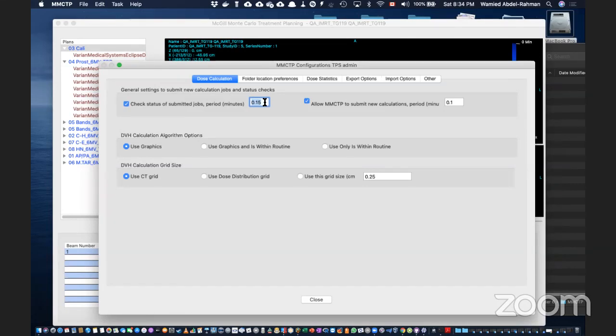I've reduced it to, I'm impatient, so I've reduced it to 0.15 of a minute. That's about 15 seconds, 10 seconds. I don't know how many seconds. Okay, there. And this is for submission.